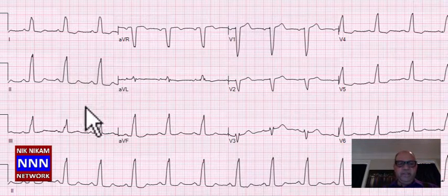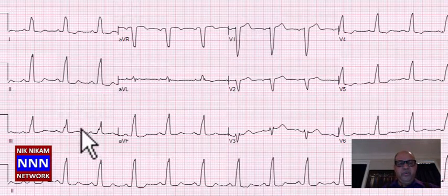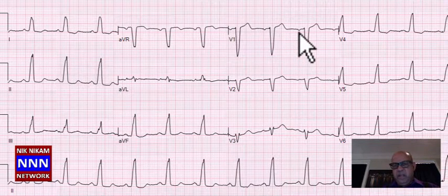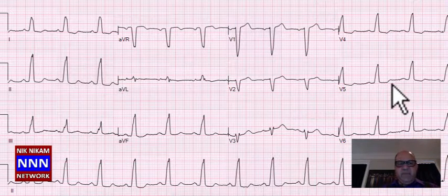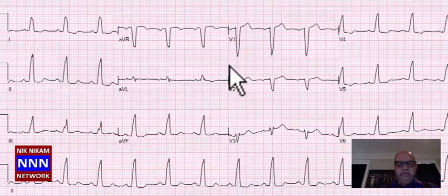Again, look at the inferior leads. They also show wide QRS, positive deflection in leads 2, 3, aVF. And if you look carefully, you may also see a left atrial enlargement. So this is a classic case of a left bundle branch block. Sometimes you can see symmetrical T-wave inversion and ST depression that may suggest left ventricular hypertrophy, but nonetheless we have some non-specific STT changes along with the complete left bundle branch block.